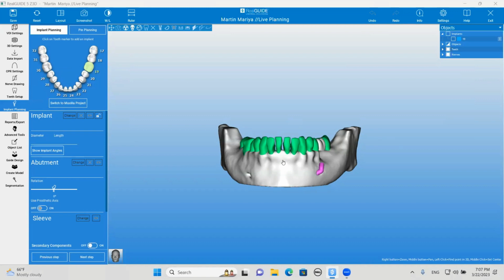Yes, so this is a 42-year-old female that would like an implant in the number 19 area. She's healthy. She has controlled hypertension. That's it. The tooth was pulled a long time ago, not by me, by another dentist. So there is some resorption of the buccal. That defect has me a little concerned, but I'd like to get Dr. Resnik's opinion on it.